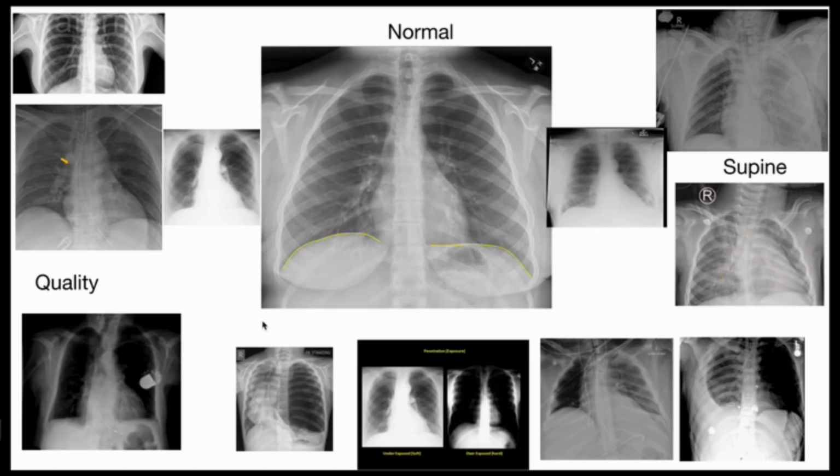Right away, without wasting any time, I'm going to start with what a normal X-ray looks like, how a well-taken radiograph will look. Right on the screen there, if you can see the screen, is a well-taken radiograph. Quickly we look at the factors. Penetration, that is the KV. It should show up to T4, that is 1, 2, 3, 4. Yes, and you should be able to make out the cardiac shadow, and just make out the disc spaces behind the cardiac shadow.